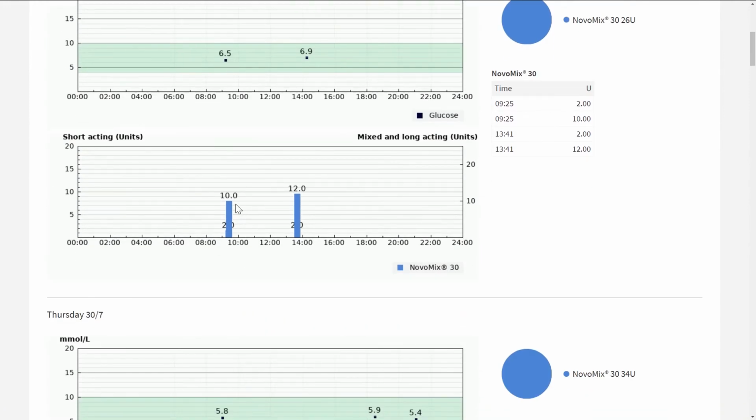Here, you'll see that insulin is represented here, and injections are represented by the blue columns. You'll see that due to the small amount of time between a priming dose and a therapy dose, the columns would line up perfectly. So to identify possible priming doses, we're looking for these numbers seen here that would sit above that smaller column, which would represent a possible priming dose.